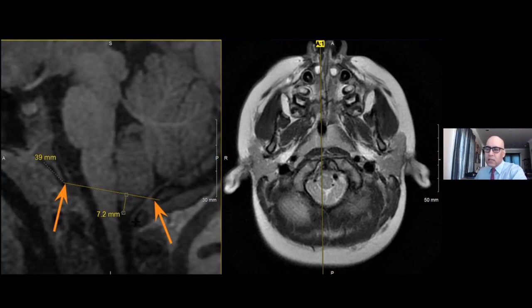Now, distinguishing between normal or borderline cerebellar tonsillar ectopia, which is what I would typically call this, versus a mild Chiari type 1 malformation, in some cases is an academic distinction, except if a patient is labeled with a definitive Chiari type 1 malformation, there's a risk that they may proceed to surgery at even minor symptoms that may or may not be attributable to the Chiari malformation.